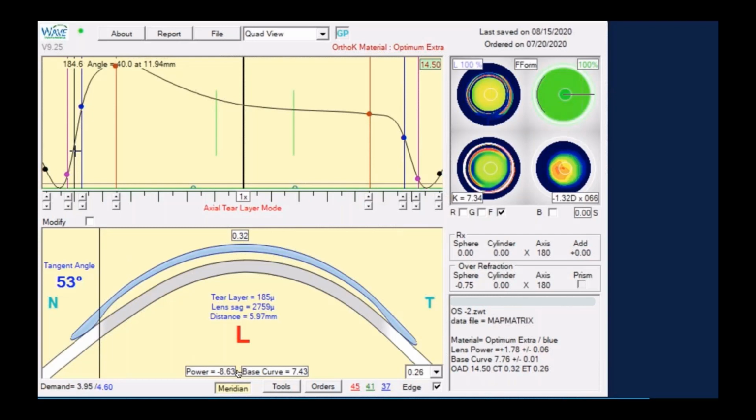But when we're talking about scleral lenses, I kind of tell docs, think of this as the area where the contact lens starts to descend to the eye, right? So basically, if you look at that area and kind of measure, that's what we're looking at. So we've got 41 microns, and you can go look at your OCT image and try and guesstimate how much you want to increase that.